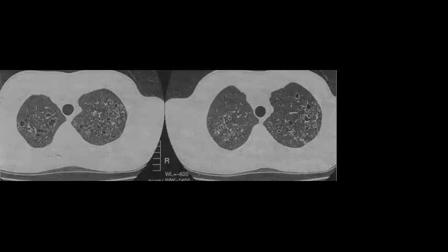So nodules with thin wall cysts or cystic appearance, bilateral in the upper lobes, and there is no pneumothorax. Bizarre shaped. So you are talking about Langerhans cell histiocytosis. And what you see in the mandible was eosinophilic granuloma in the mandible. So this is the case here.